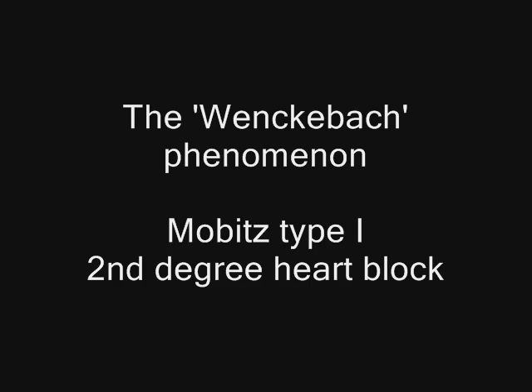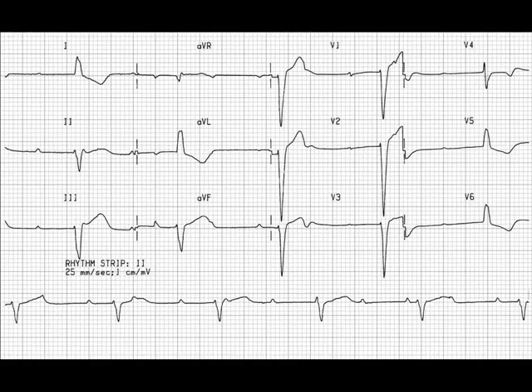This could be complete or third-degree heart block, where no P waves are getting through the AV node, but because you have a short rhythm strip of only, in fact, I think 6 complexes there, you're seeing a pattern that may be occurring by chance. So wherever you have questionable association between P wave and QRS complex, do print off a long rhythm strip, maybe 2 to 3 times the length of the 12 lead, so that you can really see whether there is or isn't an association between P waves and QRS complex.